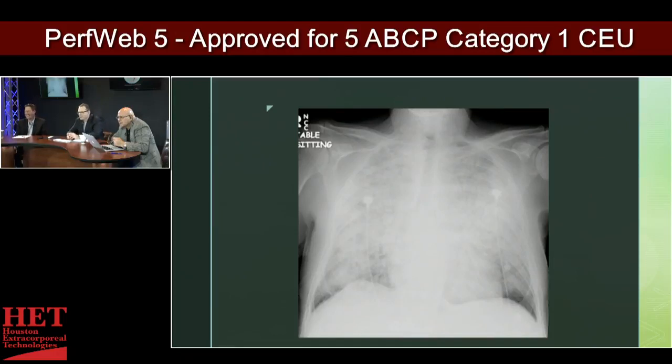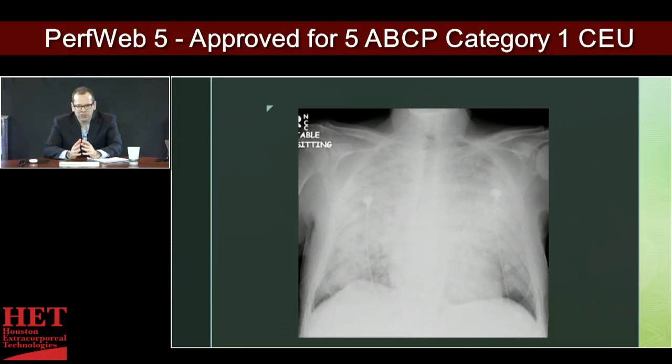So going through the years of the academics that I did, you learn to identify issues when you're initially sitting down to look at x-rays, and it's just a matter of repetition. So the first thing, again, I would do is make sure it's the right patient. We can skip that, everybody knows. Bone structures look fairly normal. The soft tissue structures, everything looks fine. I don't see a hiatal hernia. I don't see air under the diaphragm. I don't see anything along those lines or signs of trauma.